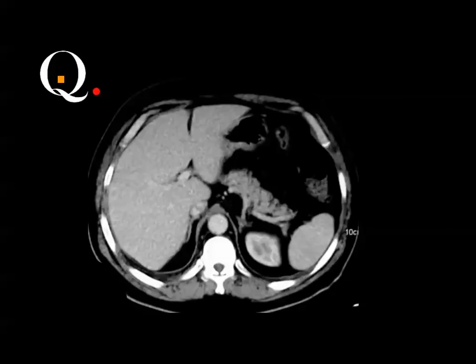Then here are a few questions for you about what I have said in this lecture. You know that this is, of course, the pancreatic tail, and this is the left kidney. And if there are two, left and right organs, you should specify the left and right one, and this is very important in reporting cases. And this is, of course, the right suprarenal gland, and here is the portal vein.